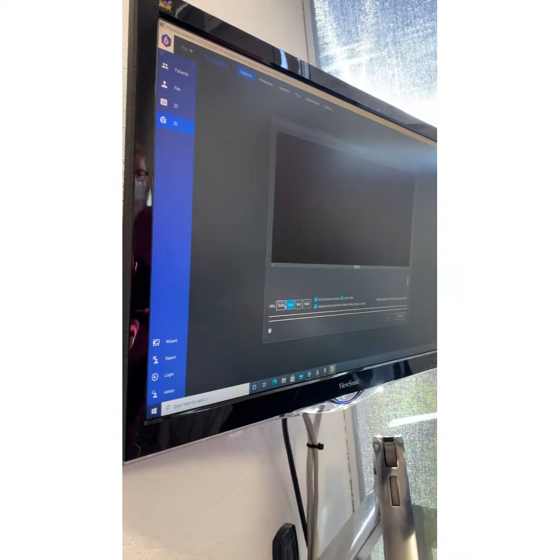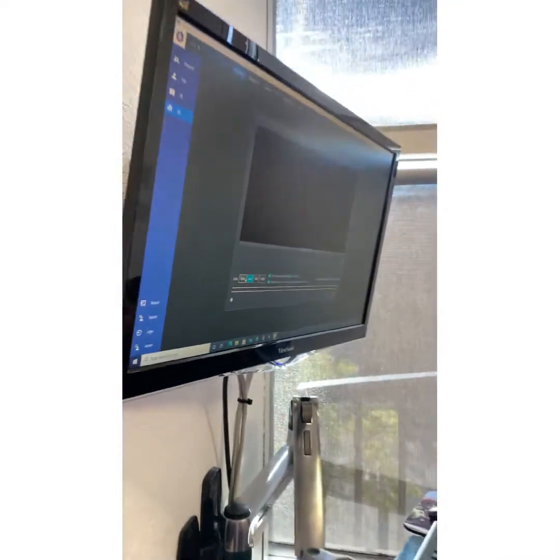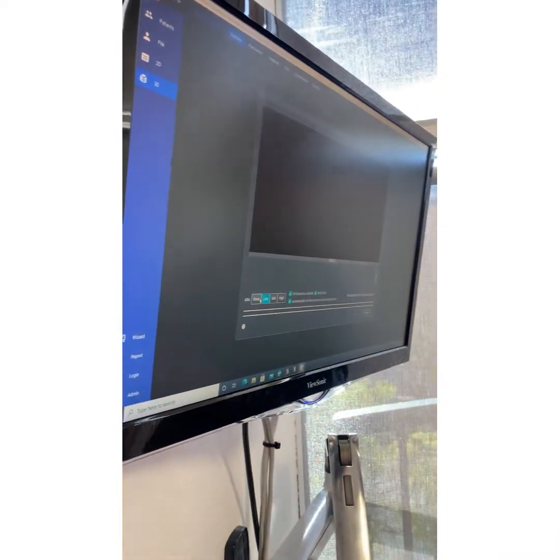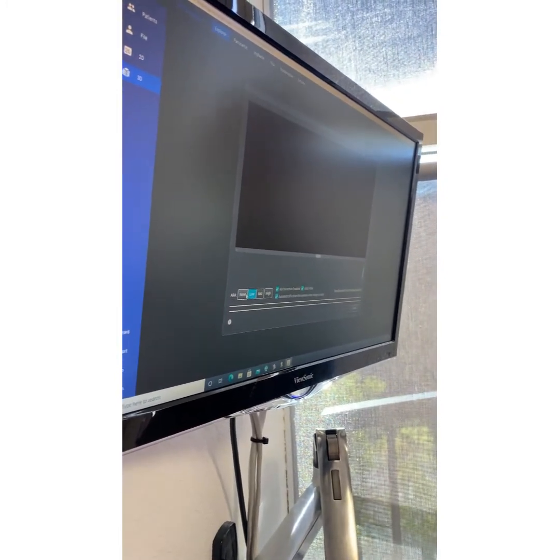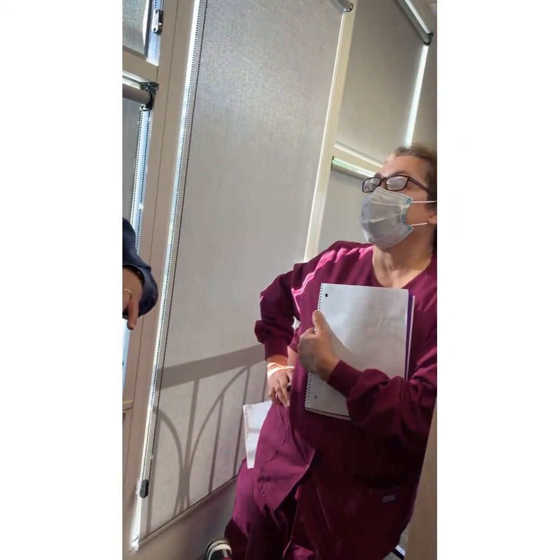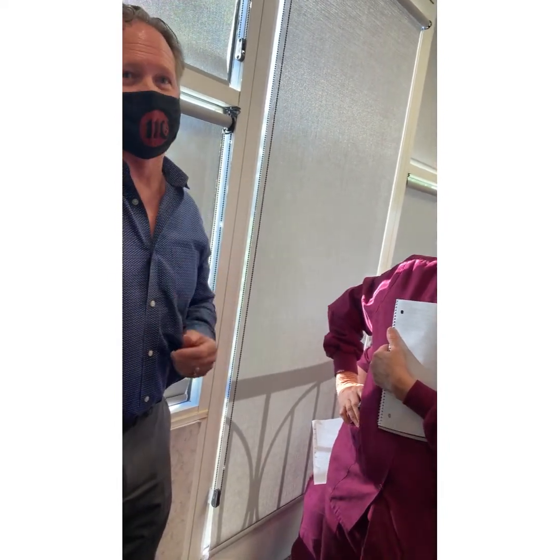The trade-off is there's a slightly longer processing time. Anytime you process the image, it adds time. If you don't do any processing, you're looking at maybe 45 to 60 seconds. If you do a lot of processing, it could take up to 2 minutes. When I first started doing this, when 3D hit the market in 2000 to 2006, it took 10 minutes to reconstruct an 8x8 volume. Not only is my wife a dentist, she's German. She doesn't want it now; she wants it 5 seconds ago.